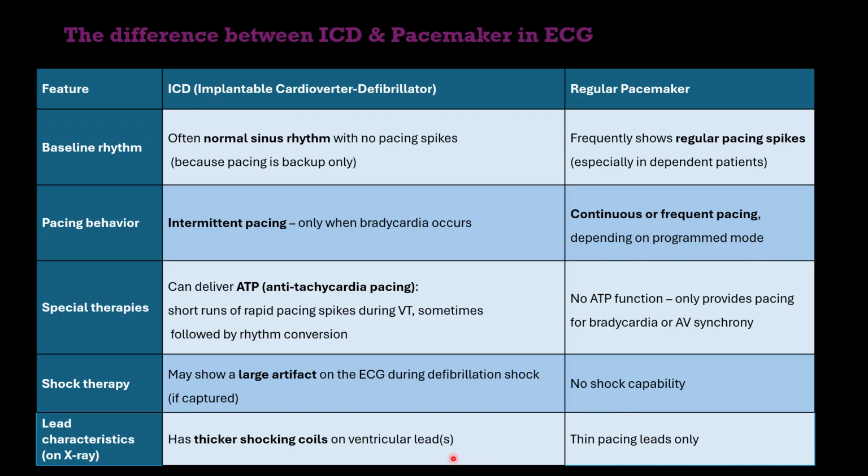Lead characteristics on the X-ray: we will see thick shocking coils in the ventricular leads. In the pacemaker, there will be thin pacing leads only.